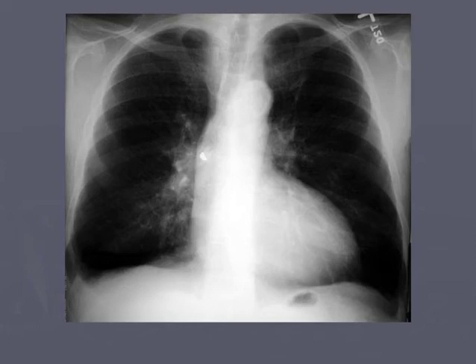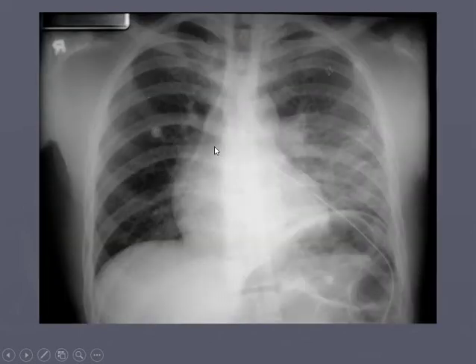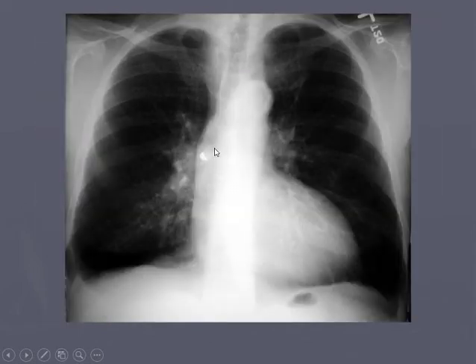All right. If I remember right, this one I believe is a swallowed tooth. Right there, this is what I'm looking at right there. That's not too interesting, not as interesting as this guy. But yeah, I believe that was an inhaled tooth.